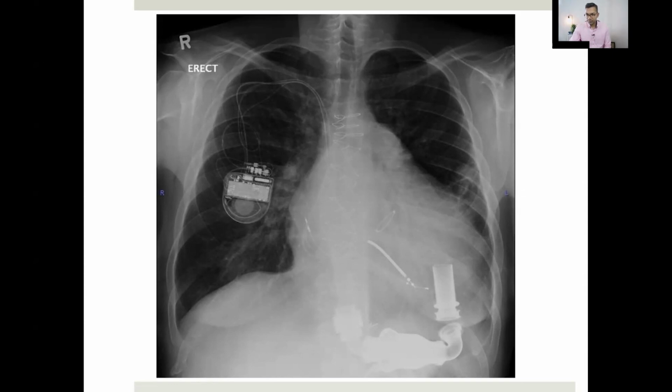And then also they have a pacemaker in situ that looks biventricular in nature, and I think it's got an AICD in situ as well. And there's something else, another artificial device in there that I'm not exactly sure what it is. Other findings on this chest X-ray is this patient does have cardiomegaly, and the lung fields appear reasonably clear. There's nothing that's really striking out to me.